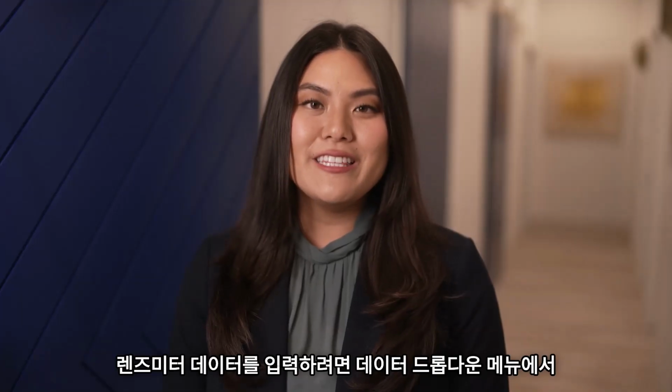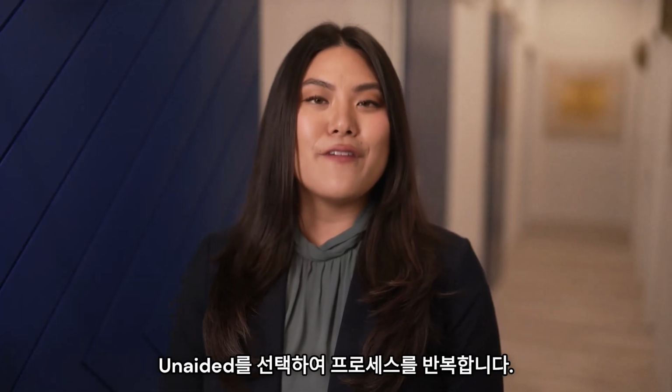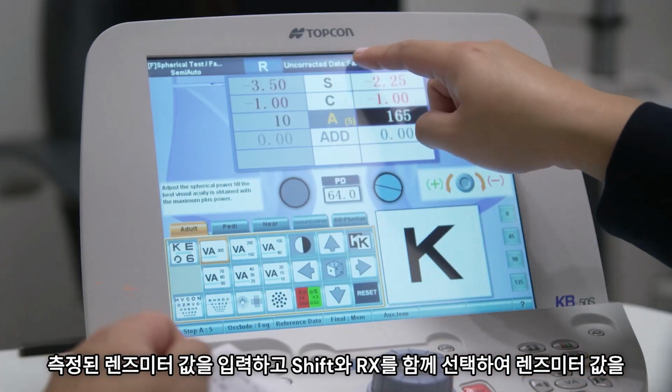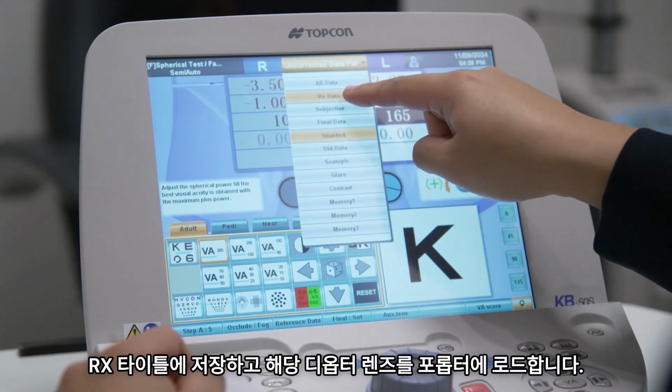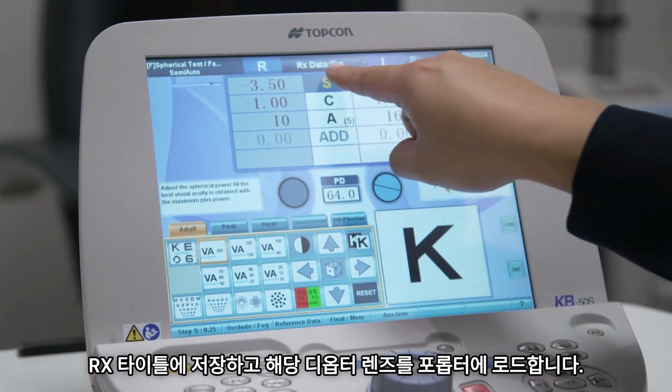If you want to enter Lensmeter data, repeat the process by selecting Unaided from the data drop-down menu. Enter the measured Lensmeter values and select Shift and RX together to save the Lensmeter values to the RX title and to load the appropriate lenses into the phoropter.